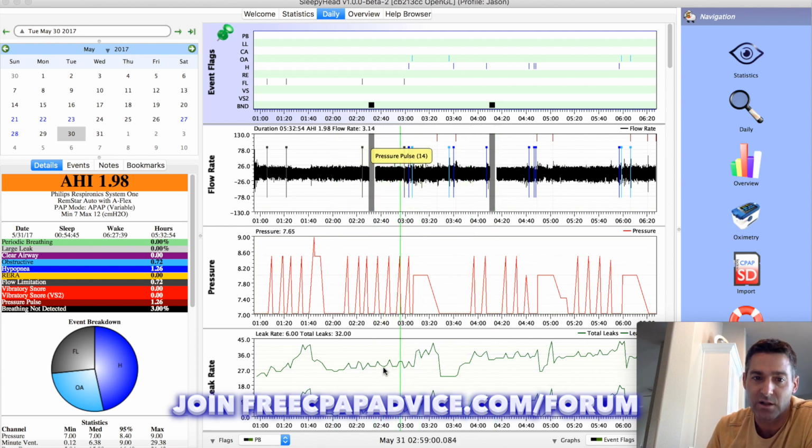Look at the data, look at the leak rate. What's causing this to go up right here? Am I having a leak? Yeah, maybe, but it doesn't look bad. My AHI is low, the breathing is stable. But you have to take in all these different variables and try to make sense of it. But again, it's about this program, and this is some of the functionality, and I love it.